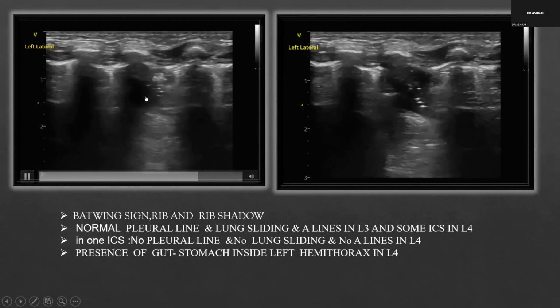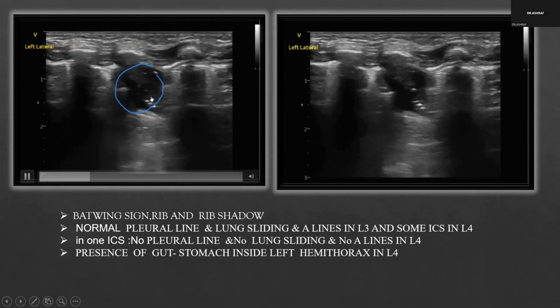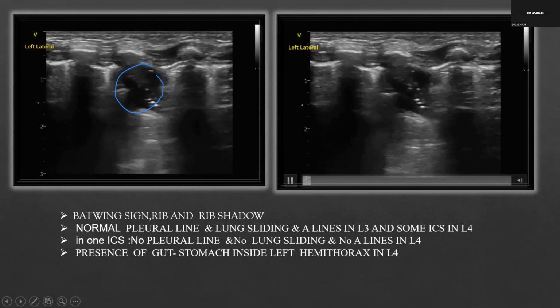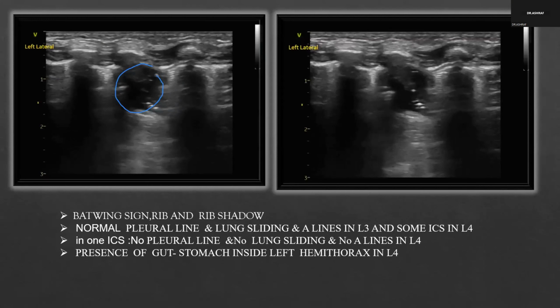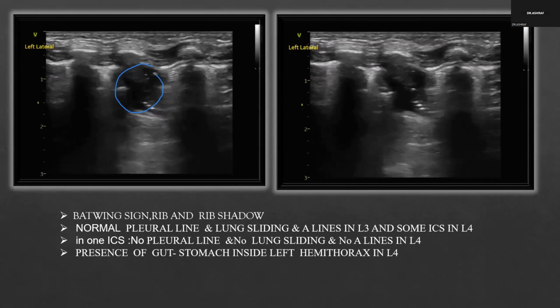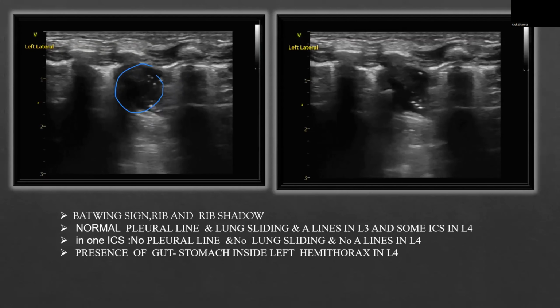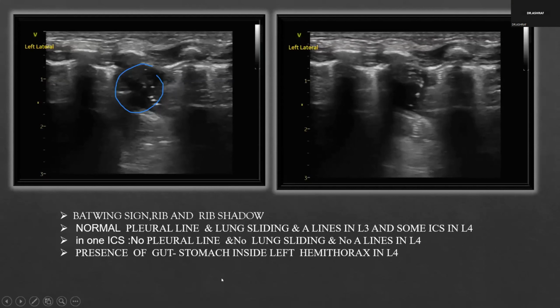This is the stomach, with peristalsis. I think this is the stomach. This baby would have been nil by mouth, right? Nil by mouth at this stage. My question is, if this was diagnosed antenatally, the baby would have been nil by mouth. No, this is a postnatal diagnosis, unbooked mother.